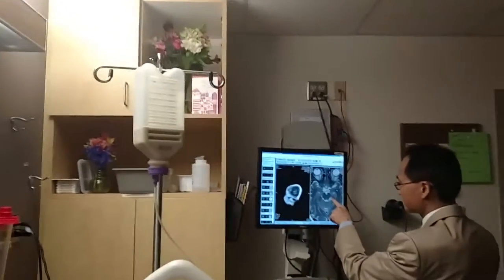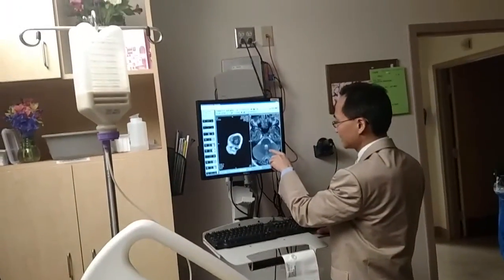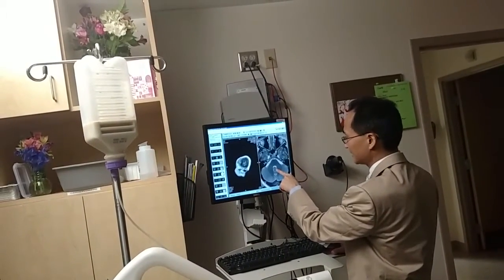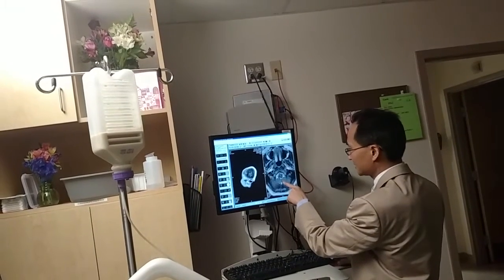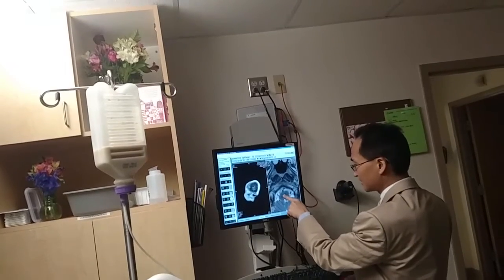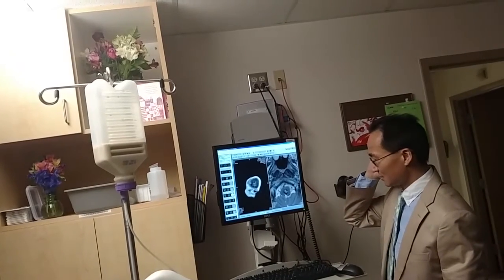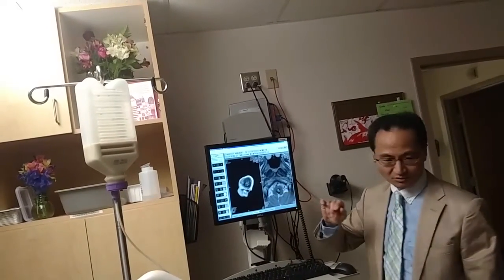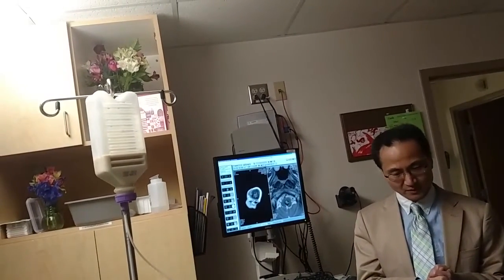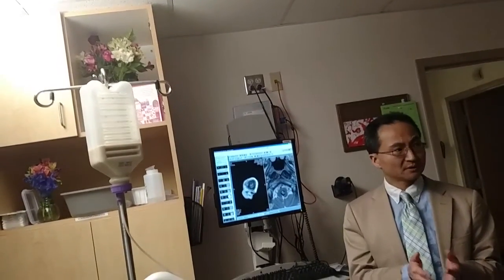This is the brainstem. The Mickey Mouse part is the top of the brainstem, and then that's the pons, and as you go down at your level, this thing is centrally localized. So it's right in the center. That is why I did not recommend to go, because it's centrally located. To split open the brainstem is something we do, but it's much less risk to split open the spinal cord. We do that a lot more commonly than the brainstem.